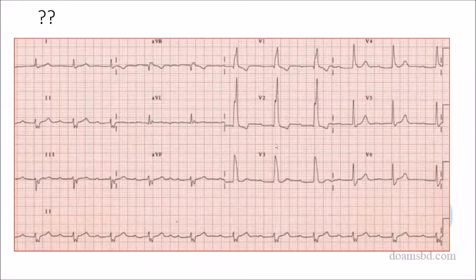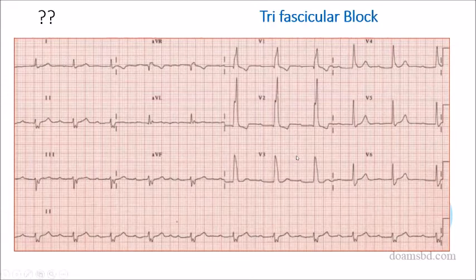And the wide also, are we confident that this is more than 3 or not? Wideness is this. Yes, wide also. Possibly it's 3 or not more than 3. Okay, so we are busy with the bundle branch block here. So you are right, there is a bundle branch block, no doubt. Maybe intraventricular conduction delay is there. But why are we telling trifascicular block?